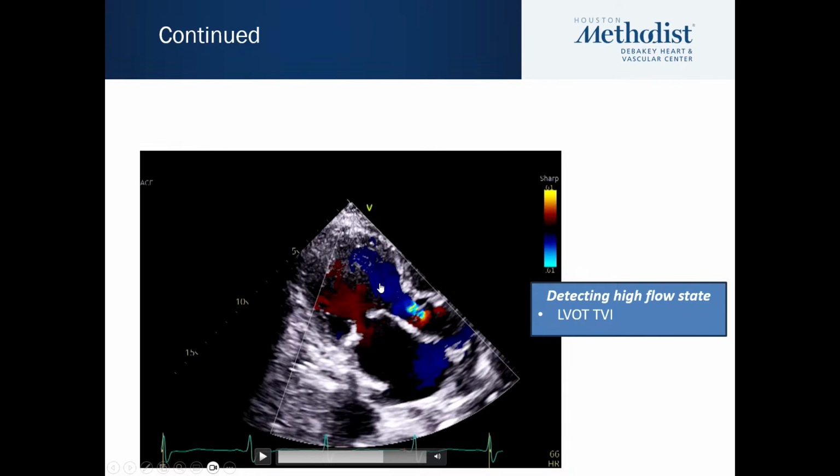So be careful with the jet height actually showing you a whole lot of color in diastole. That doesn't necessarily mean that it's severe disease. There's entrainment and changes on color Doppler that can make the jet height appear more impressive than it is. And that's why you should not go by what's happening here, but actually go by what's happening here.